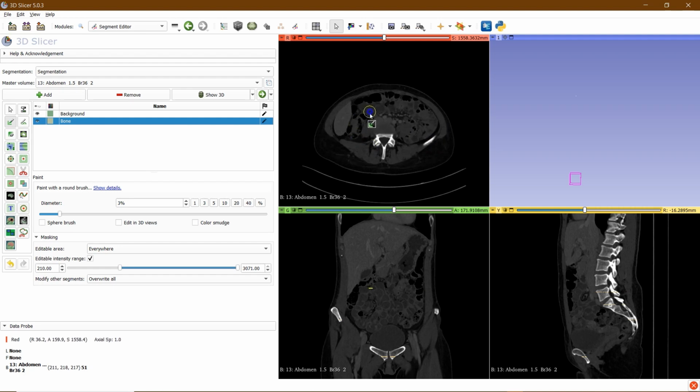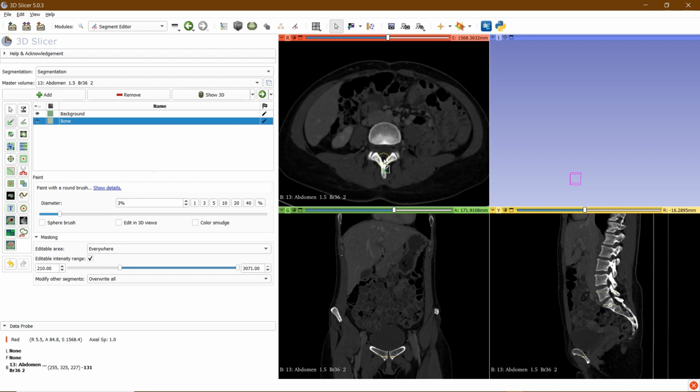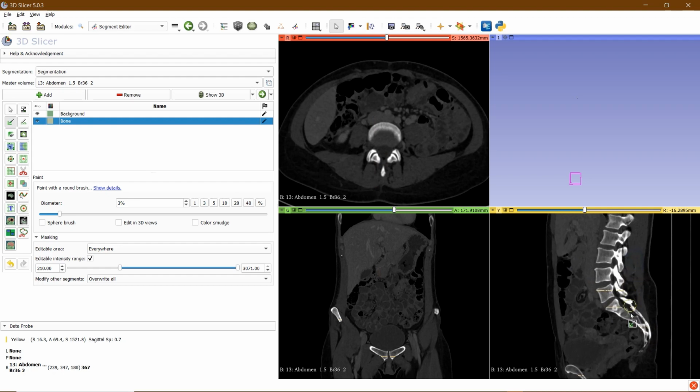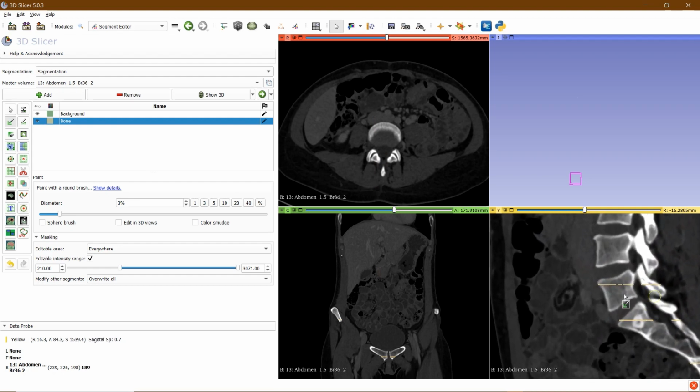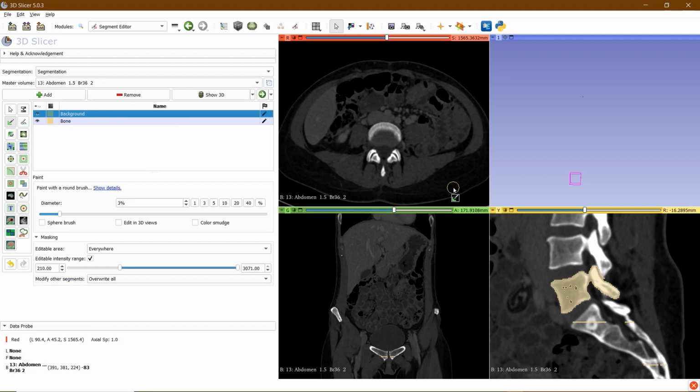In some anatomical regions, the orientation might sometimes be a little bit difficult. In those cases, it can help to change to a different reconstruction plane, because every slice you mark there will also be displayed in the other reconstruction planes. So in this case, it is much easier for me to make the distinction between the fourth and fifth lumbar vertebrae in the sagittal plane.